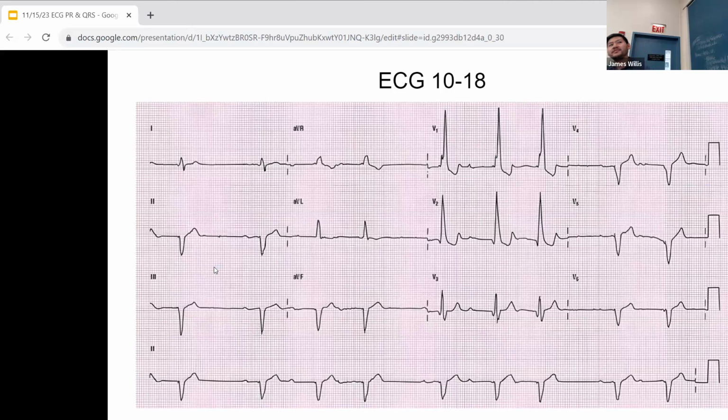Sinus rhythm. Dr. Sinner says occasionally you don't get this long to assign your EKGs. Let's see.